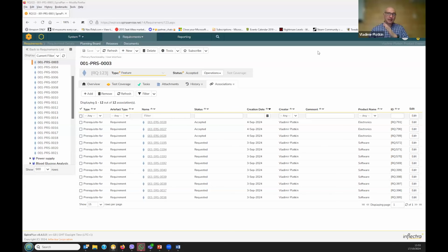On the right-hand side of the testing, you have the exact same thing. So you can test your system level requirements, which go into the system project, and that's where you test them at the system level. For the architecture and the design, there is a way to do so. You can create additional things. I didn't demonstrate it during this presentation simply because of time limits.